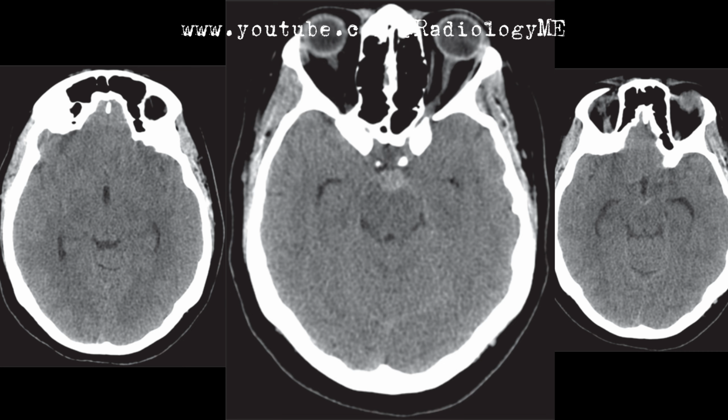What other imaging findings might you look for in cases of subarachnoid hemorrhage? I would emphasize the importance of scrutinizing the basal cisterns, sylvian fissures, and the third ventricle for hyperdensity. I would also pay close attention to the foramen magnum for signs of tonsillar herniation, which might suggest raised intracranial pressure. 2. What are the potential complications of untreated subarachnoid hemorrhage?